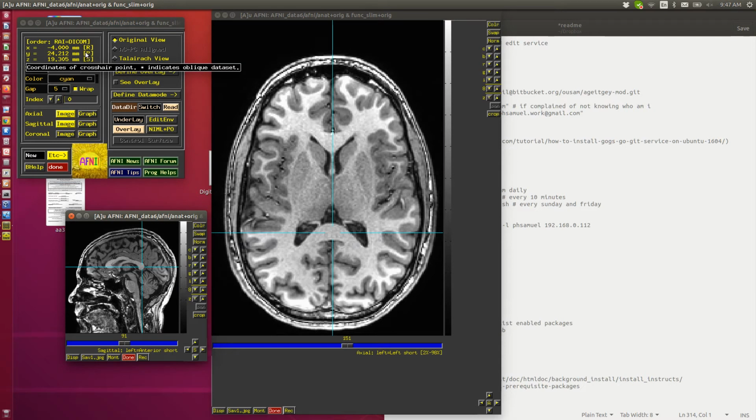If I right click, that's where having a 3-button mouse is handy. If you're using a Mac, that means you have to press one of the keys on the keyboard or click on the right side of the trackpad, depending on what version you have. But if I right click, I get a pop-up menu and I choose the second one, and now I get the coordinates where the signs of x and y are reversed.